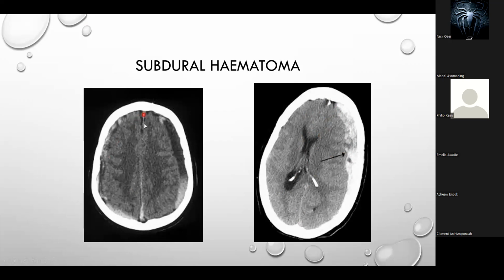Look at this midline here. The falx cerebri is right in the middle, but over here it is shifted away. So it's moving the ventricles also away from the site of the bleeding. So this person has an acute subdural hematoma with pressure effect. So there's a pressure effect here. The bleeding is expanding and is pressing the brain matter to the other side.